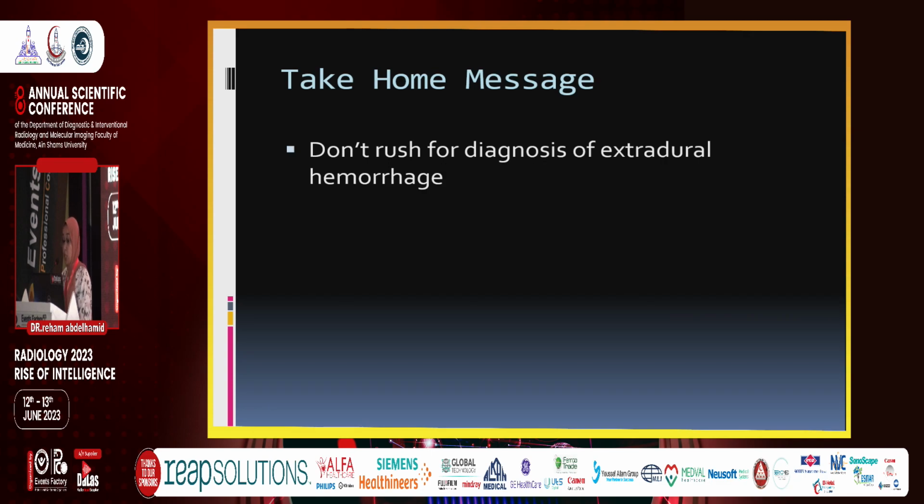Let's take the home message: don't rush for the diagnosis of extradural hemorrhage before proper assessment of the bone window for osteolytic lesions, for the possibility of tumor or mets.